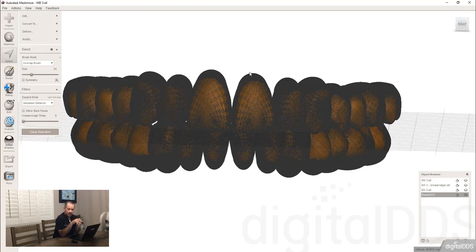If you hit R accidentally, you're going to be in trouble because you're now taking something that has very small triangles and trying to make them even smaller. And it's going to take forever for your system. And you might as well just close out of Mesh Mixer and go back in. But if you hold down Shift R, that is the shortcut for reduce. And I could have just shown you where to find that in the menu. I'll try to remember to do that again.